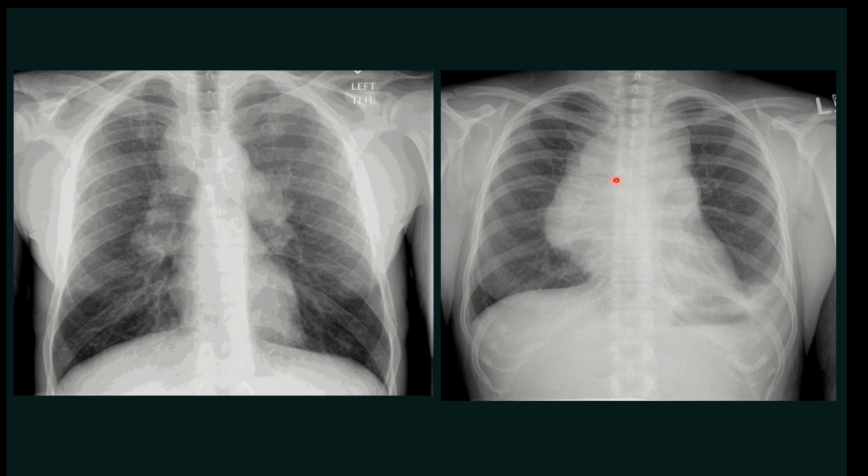And in lymphoma, the nodes are almost homogeneous. There is no distinction or lobulations usually seen. The lobulations are there, but on the surface, not in between the two opacities.